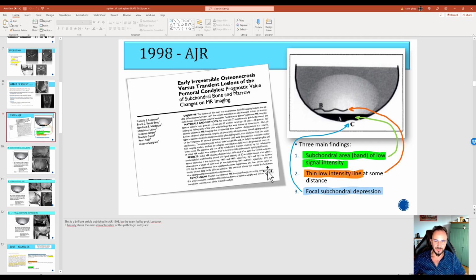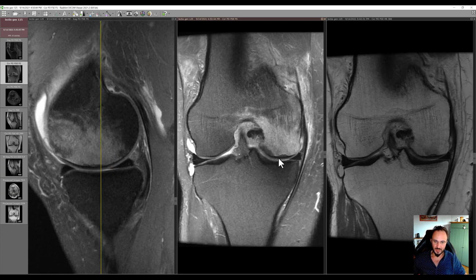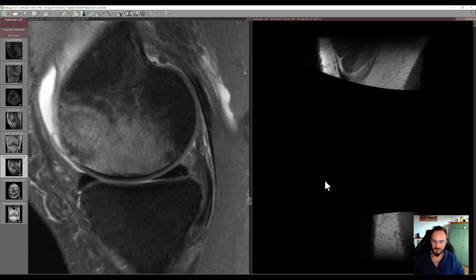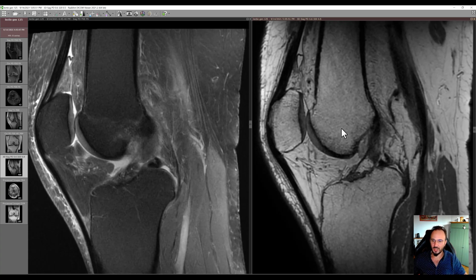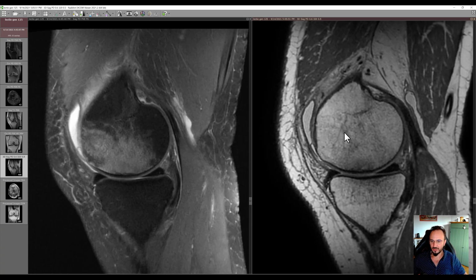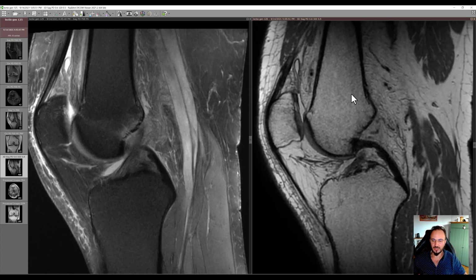And all these are called subchondral insufficiency fracture. In this case, we can see there is no cortical depression yet. This pathological entity usually heals with restitutio ad integrum. It means that if it heals properly, it leaves no marks. So the patient will be as good as new in a while after rehabilitation.